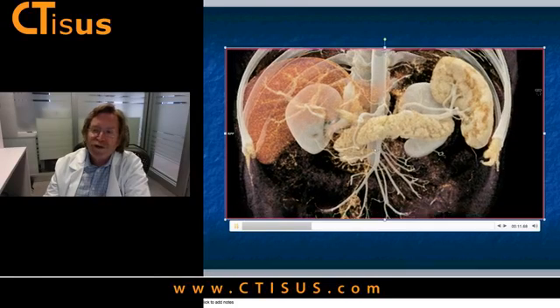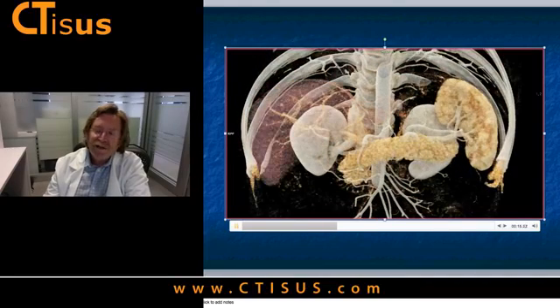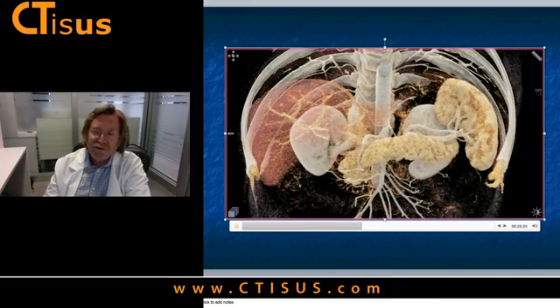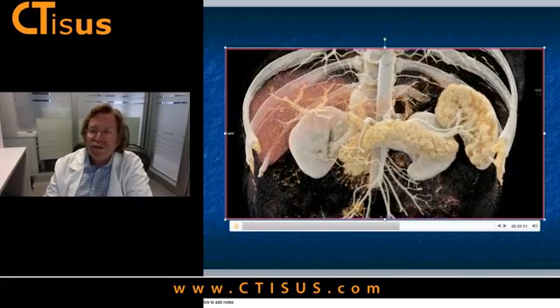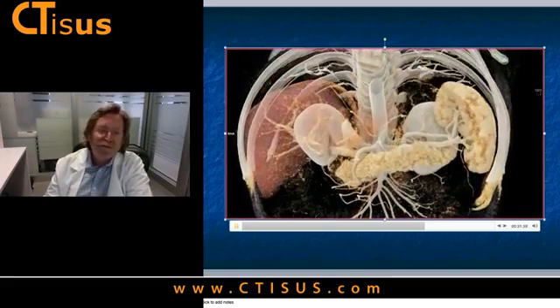Wow, this is really going to look identical. I was showing this at a conference yesterday to some of the surgeons, and they were saying, actually, it's better than what you see at surgery. At surgery, there's blood and fluid, and you kind of know where everything is, but you never get the same views. So imagine this as a preoperative for a laparoscopic Da Vinci procedure.